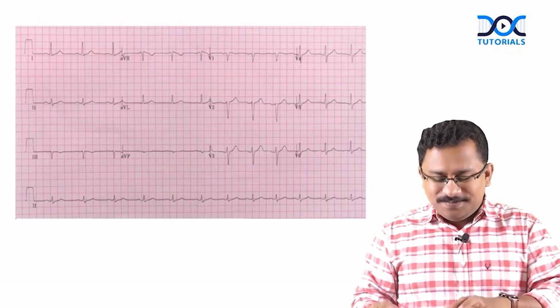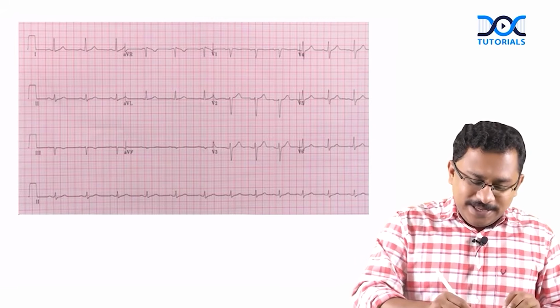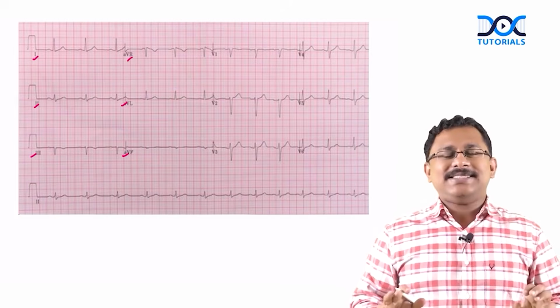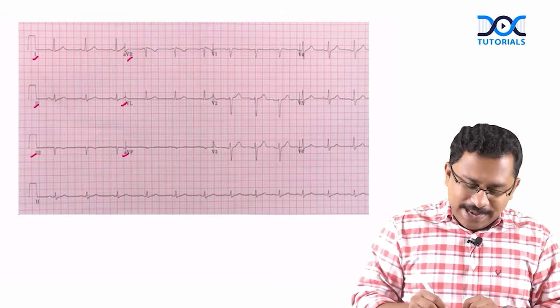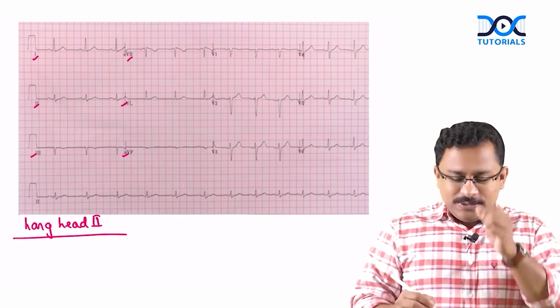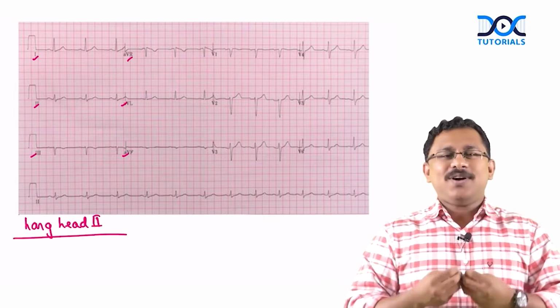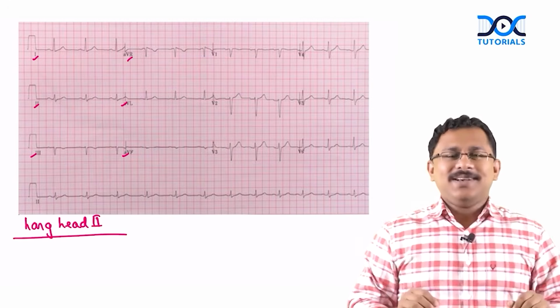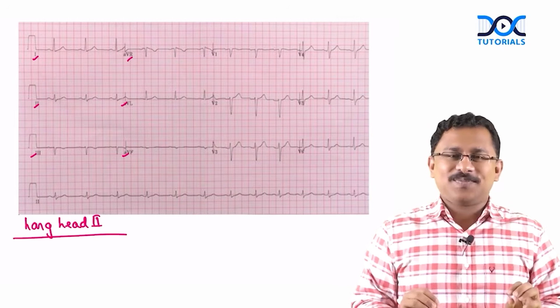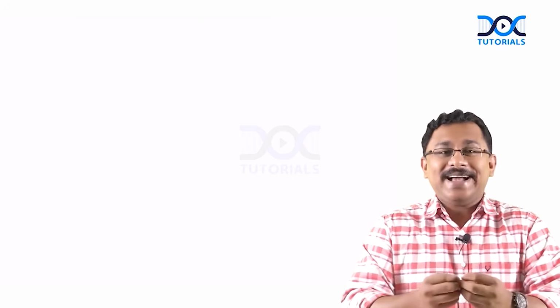Now when you take into account the ECG recording, you are seeing in the figure the various leads used for recording. Always in ECGs for rhythm analysis, you will have a long lead 2 recording, taken for at least a 10-second interval, so that you have a good analysis of the ECG rhythm. Now let us move on to the various cardiac rhythms.